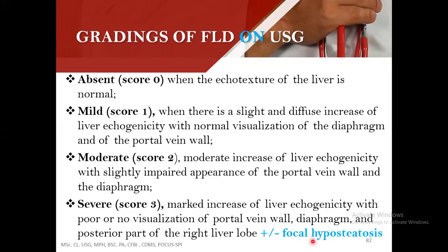So plus or minus focal hypo steatosis, plus or minus. There will be some deposit of some black or dark fatty component also.